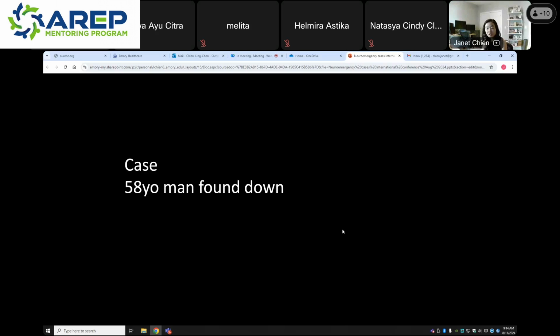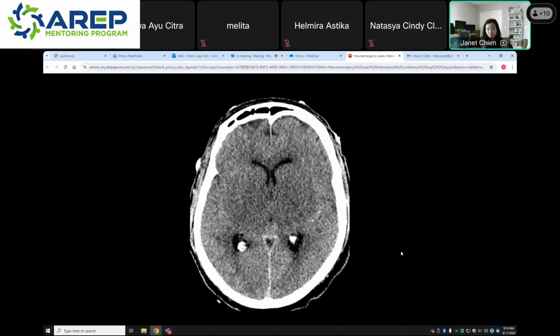All right, next one is a 58-year-old man who was found down. So I'll give you some time. Anyone who sees anything, feel free to speak up.